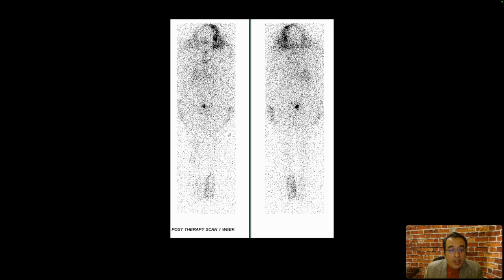Here's our next patient. We have anterior and posterior whole body images from their I-131 study. They were treated with high dose of I-131 after total thyroidectomy when they were diagnosed with thyroid cancer, and we typically call these patients back 1 week after high dose treatment to look for any additional sites of metastatic disease that may be seen. But here, interestingly, we find uptake outside their head in their hairs on both sides, also in their hands and in their feet.